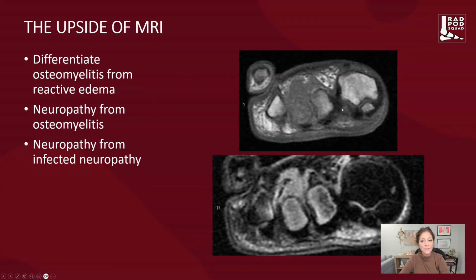Notice that the fibular sesamoid is not actually enhancing on post-contrast imaging shown here. So that actually is reactive edema, but we can see the enhancement of the bones here. And of course, that marrow replacement is enhancing with abscess and pus extending dorsal and along the extensor tendon in this patient who has osteomyelitis and septic tenosynovitis.